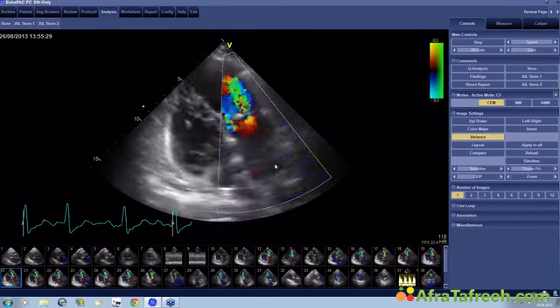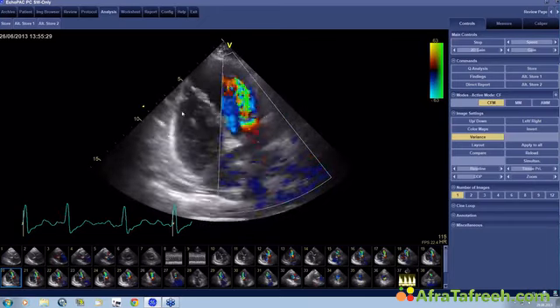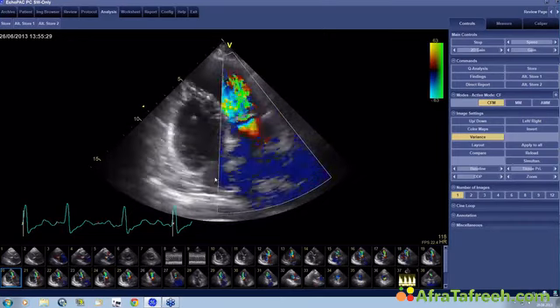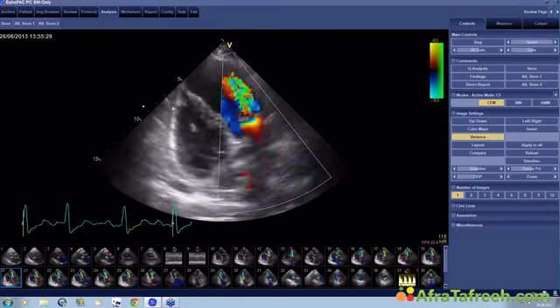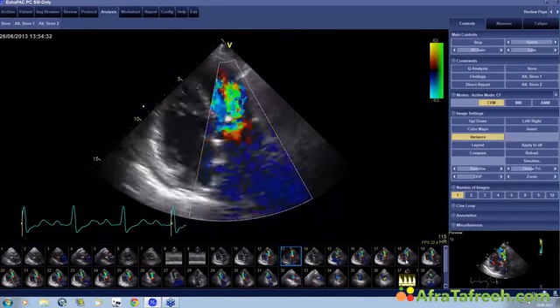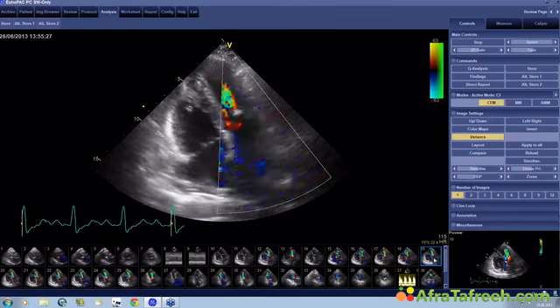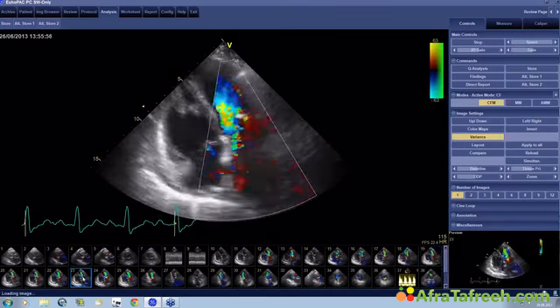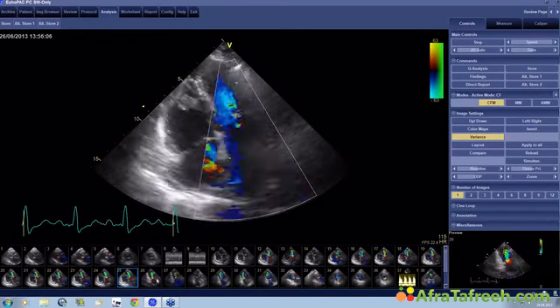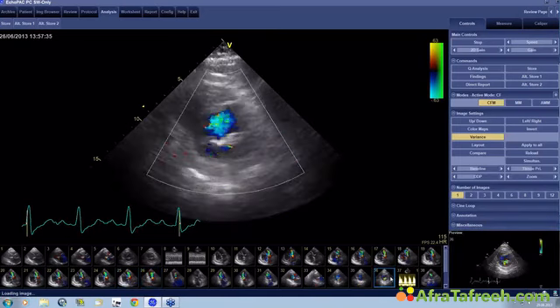And she had very high pulmonary pressures, and as you can see here, the right ventricle is now starting to fail. Look, the right ventricle is dilated, and right ventricle function is poor. It's just moving up and down, but it's not moving inward. This was not a good sign. So she was really deteriorating, and taking it from there, I can give you the final conclusion of this case. We simply had to operate on her. There was no other way.